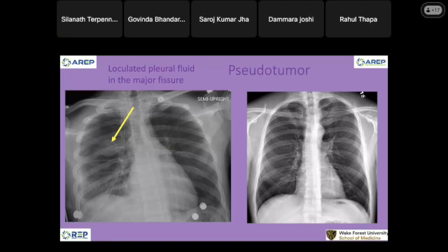any infection will cross that fissure and go to the right middle lobe. So it depends on the barrier of that person. It really can be a complete fissure or an incomplete fissure. So this one is an example, so quick.